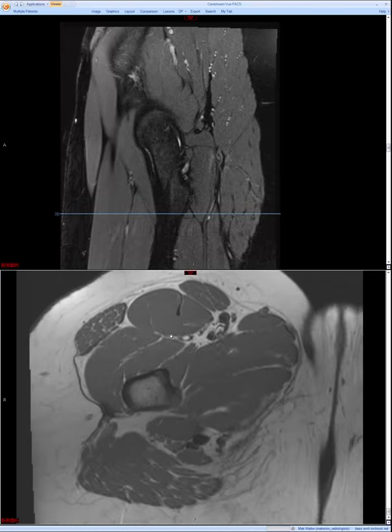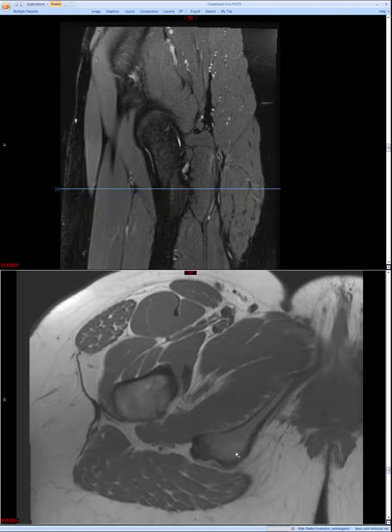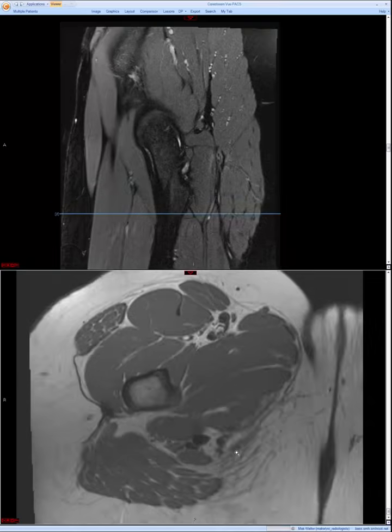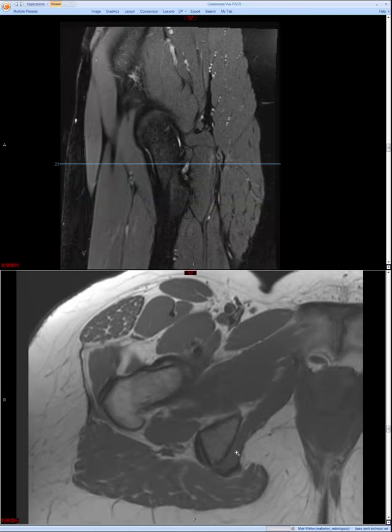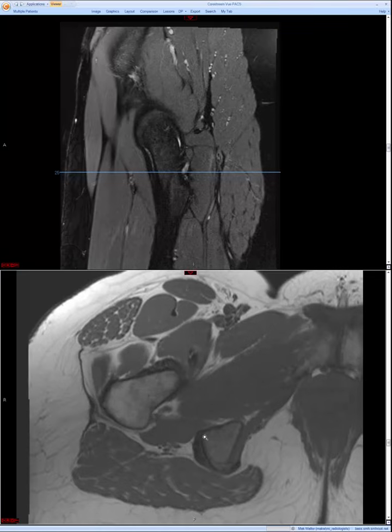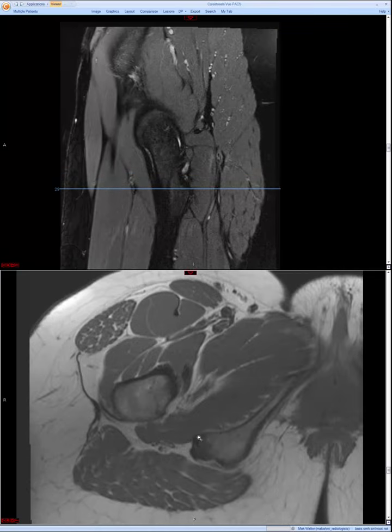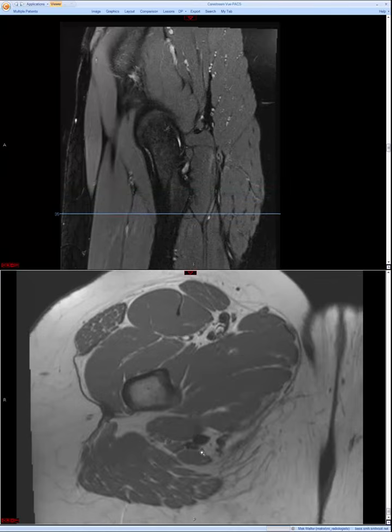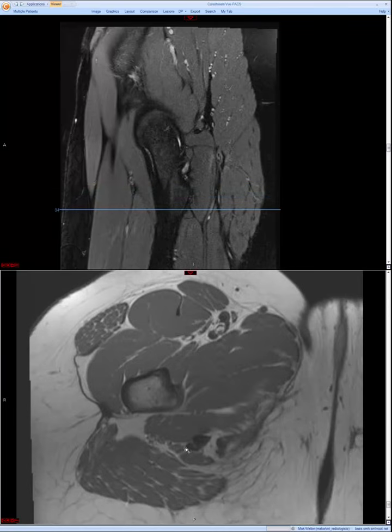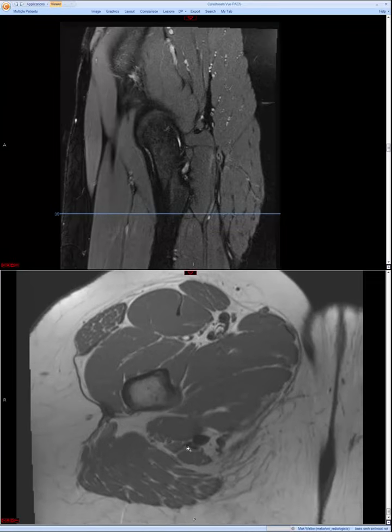And as we scroll through now, we will talk about the hamstring tendons, and this I think is an OSCE favorite as well. So there are two discrete tendons that come off the ischium here. So the deeper, more lateral one is the semimembranosus, and then not shown well, unfortunately, here, the more superficial medial tendon is the conjoint tendon, which will eventually give rise to the biceps femoris as well as semitendinosus muscle.